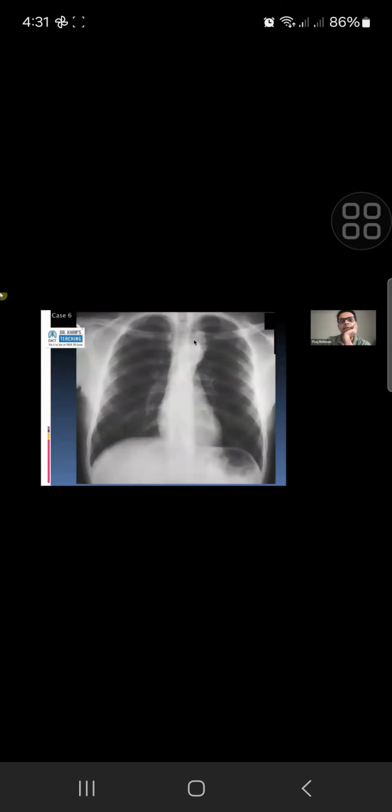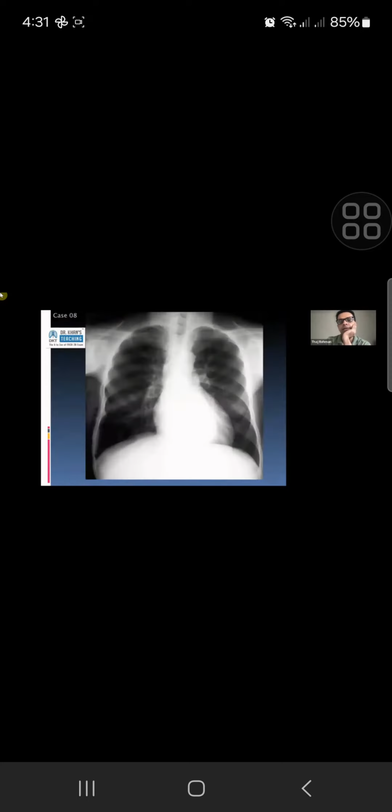If you look at the previous X-ray, sorry, I'll show you another X-ray for comparison. Look at that clavicle. The diaphysis or the marrow cortex is a lot more thick, and the ribs are not that wide. So there's definitely, in comparison, in this case, the ribs are wide, and there is marrow hyperplasia. And with that information, this posterior mediastinal mass, you got it right, extramedullary hematopoiesis.